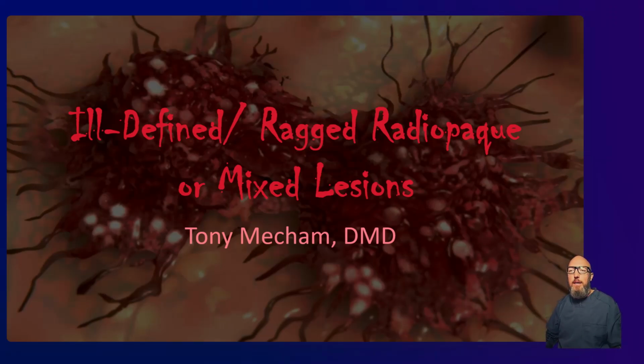This is topic 11, the ill-defined, ragged, radiopaque, and mixed lesions. So again, have your study guide and chart handy as always.